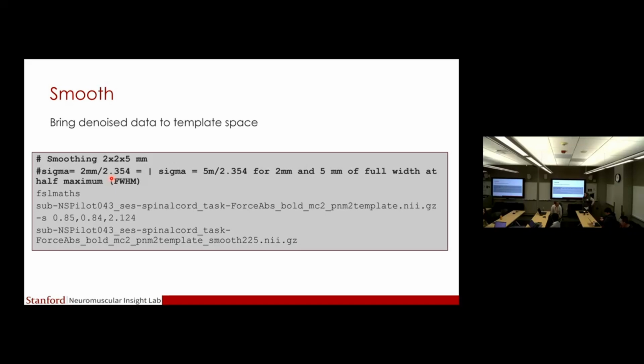And actually, I have a question here. Wouldn't it be an issue? For resting state, I think that won't be an issue because sometimes we don't want to smooth, to artificially inflate the correlations between the ROIs. And would that be an issue for registration to the template?